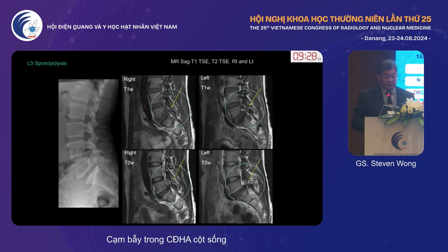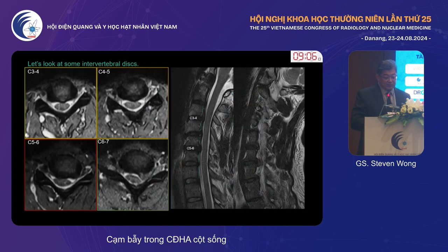All right, so once you have that, then you actually need to refer to the x-rays, because x-rays are better at showing spondylolysis than MR. MR can be quite difficult, and sometimes if you're lucky, your MRI technologist gives you a very nice image, but most times it's in between, there's partial voluming, and it's actually quite difficult to make it out.